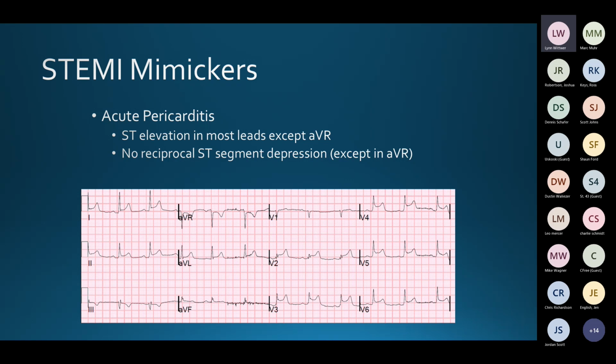Well, this would be the tip off. He has too many areas of the heart involved to be anything except a pericarditis, because you can't have an acute anteroseptal lateral inferior infarct, because the patient would probably not survive that.